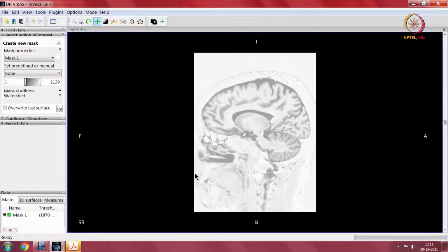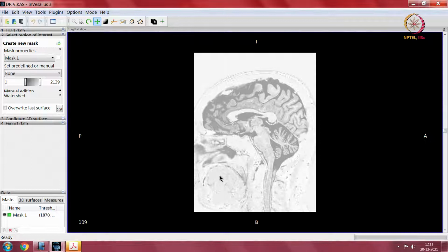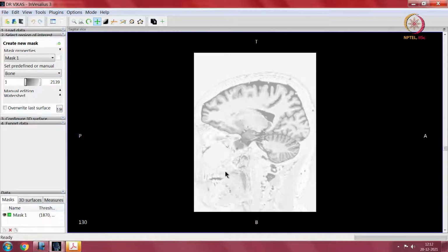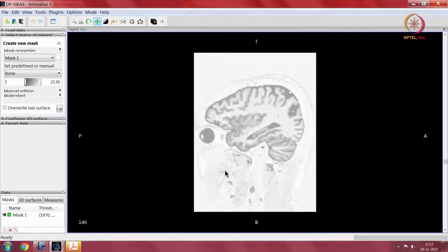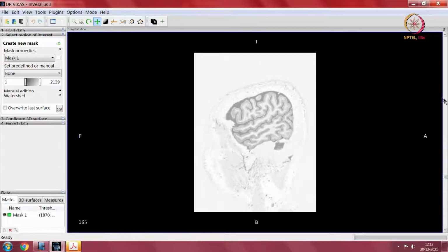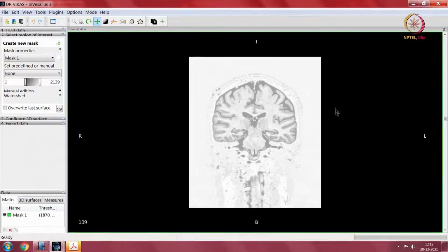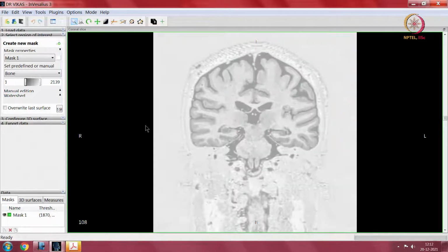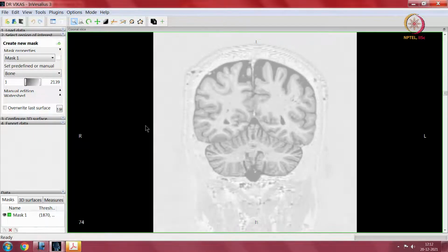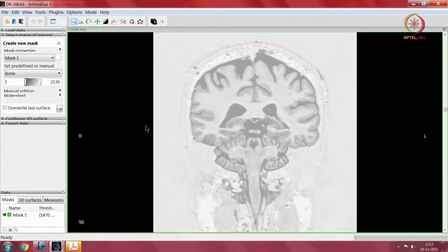Coming towards the midline, you can make out the nose here, tongue here, and then the opposite side of the brain. So, this is sagittal. I am repeating so as you become familiar with the terminologies and what set of images are associated with that. The last kind of sequence is the coronal sequence. So, coronal sequence is side to side. So, how do I show side to side? I should show back the eyes and then you would get an idea.